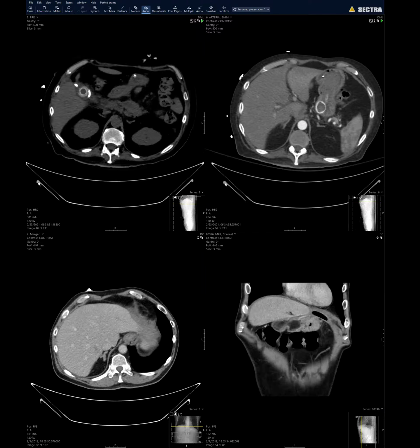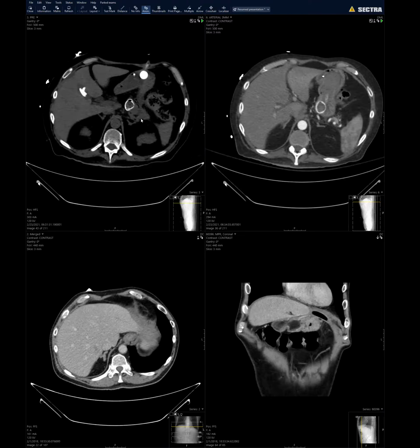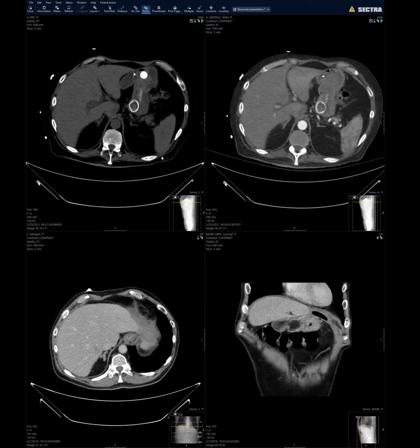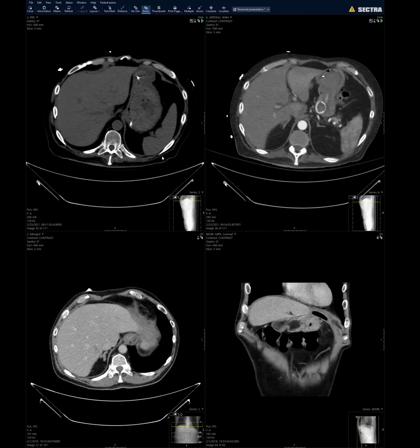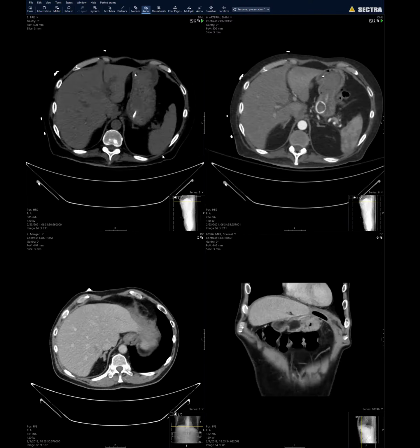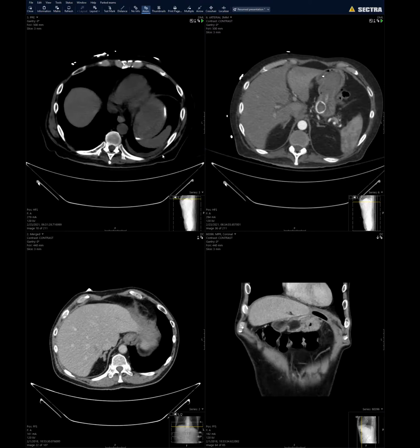And then he presents with hematemesis. So we did a GI bleed protocol. Our GI folks are placing those things all the time. Yes, they are, endoscopically. So any observations on the non-con before I go to the post?